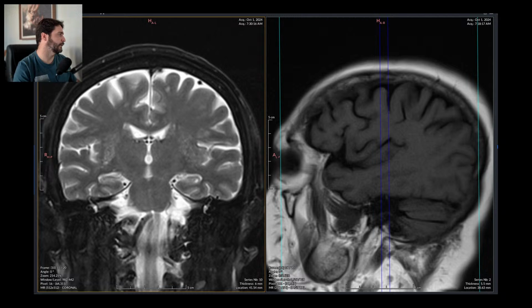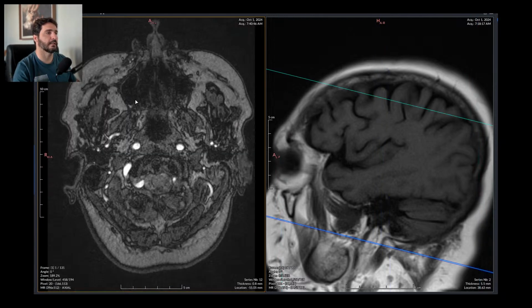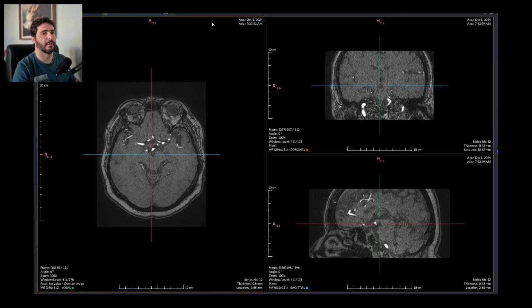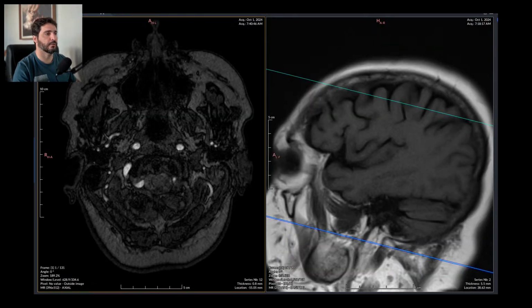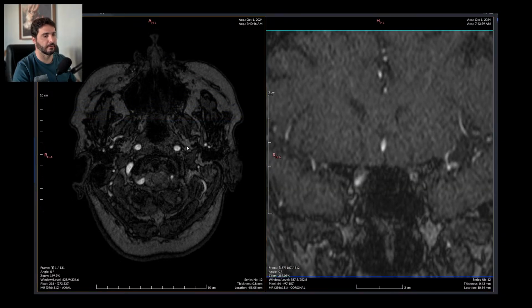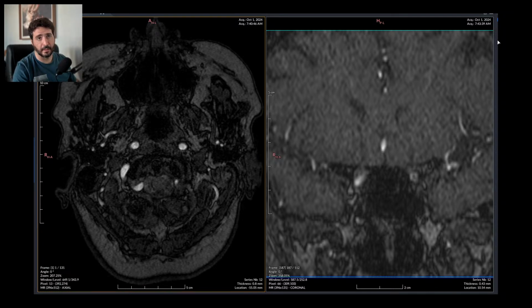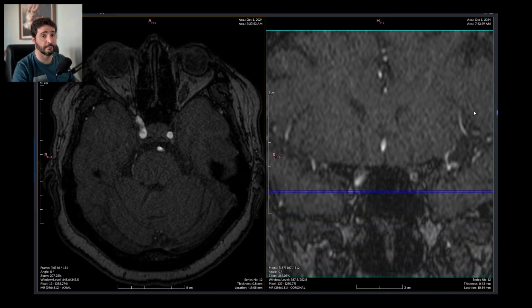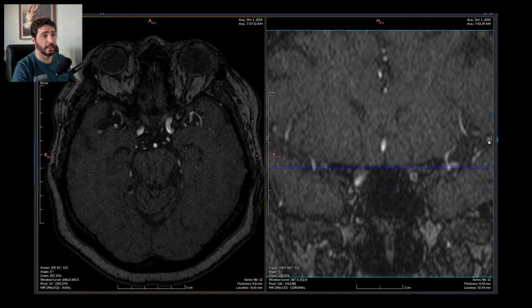This is an arterial cerebral MRI angiogram for headaches. 63-year-old patient has headaches, so we grab an angiogram. This is mostly noise and very little signal. So this is a very poor quality exam. Nonetheless, we are going to report it because it won't report itself. It has been done. It has been uploaded.